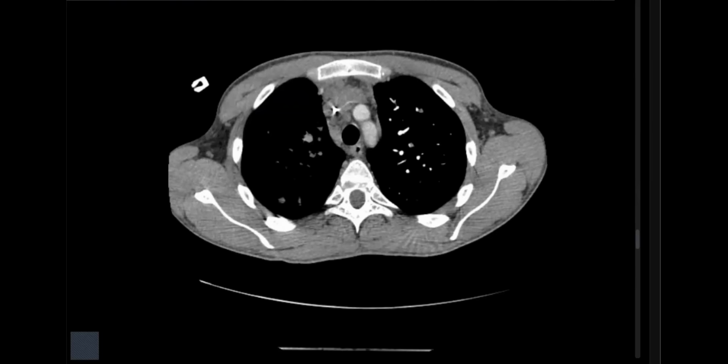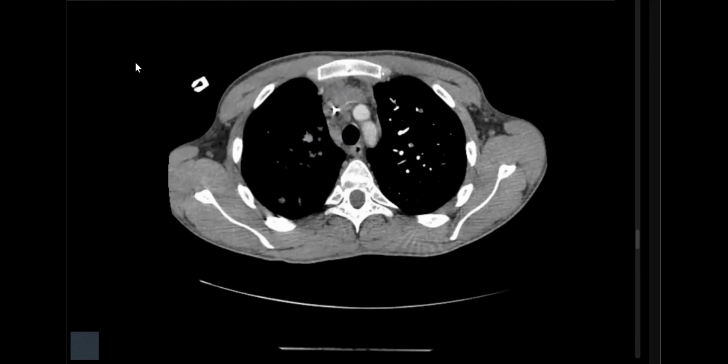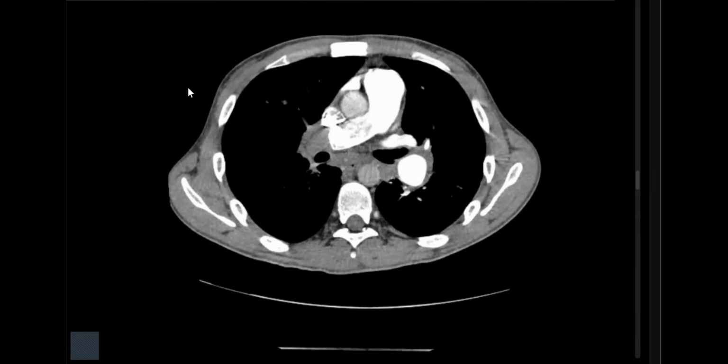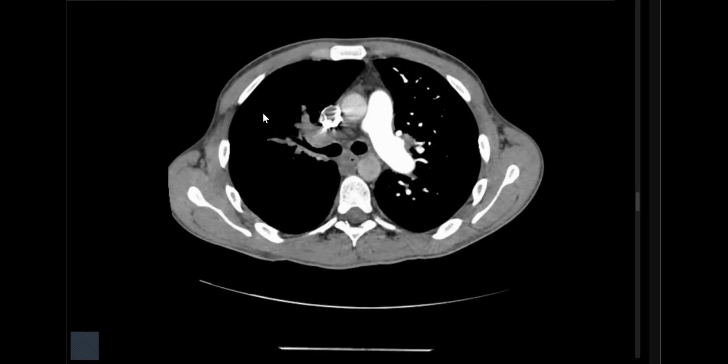I have been presented with axial chest CT with IV contrast for a patient who is an IV drug abuser, presented with filling defects in both main pulmonary arteries and left main pulmonary artery aneurysm with multiple cavitary lesions representing septic emboli. In this case, I will urgently convey my finding to the referral doctor and refer this patient to the pulmonary and vascular MDT team for management.